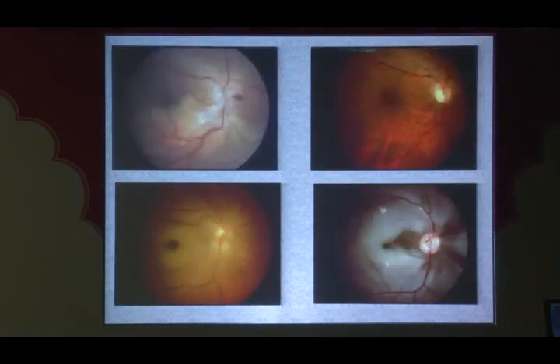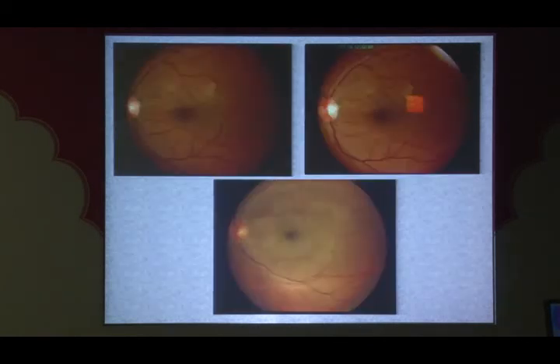Coming to ischemic yellow-white lesions, we are all aware of these things, but I would just like to draw your attention to some of the subtle yellowing that may occur. Patient may complain of vague visual obscurations, and if you observe closely, you'll see an intravascular yellow lesion within the vessel, and that is the intravascular clot. As you can see on this picture more clearly, there are multiple of them actually. So these are things that should not be missed.